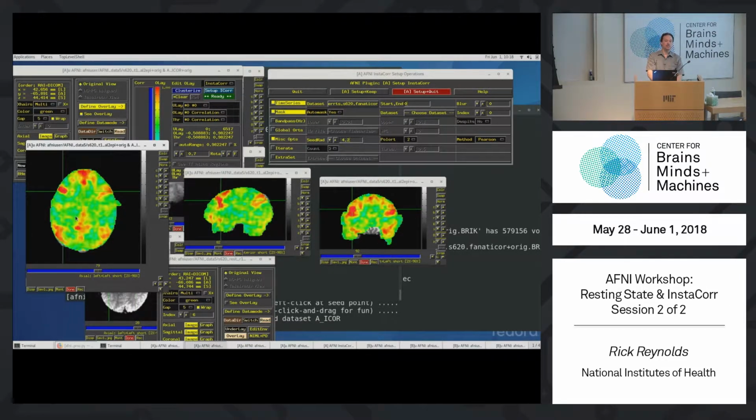We can also just scroll and reflect on this stuff. Yeah, you can do this talking with SUMA and have this projected in SUMA. I think Daniel will actually do that with you today. But you can also do InstaCorr in SUMA. If we ran a surface-based analysis in here, you could take the surface time series and do this InstaCorr in SUMA. It'll look fantastic.